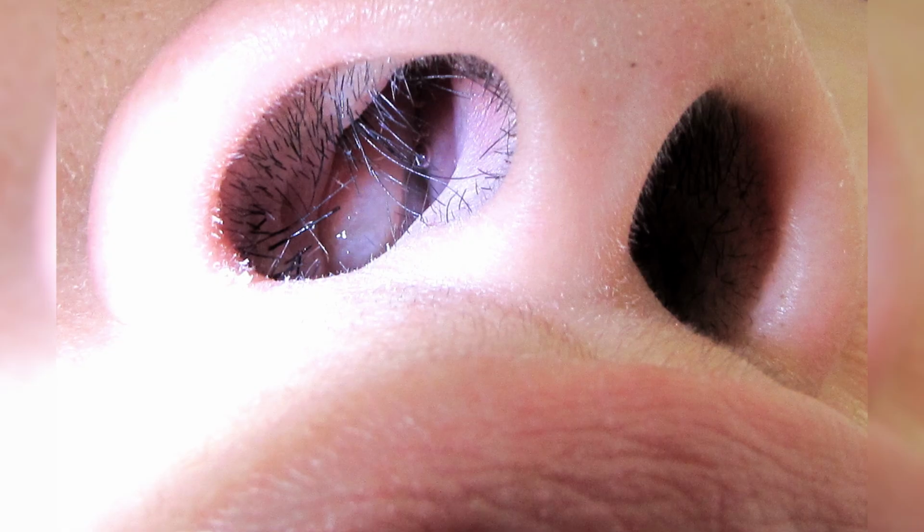Clinically, antrochoanal polyps are more common in adolescents and young adults, though they may occur in children, as illustrated in this case. The most frequent presenting symptom is unilateral nasal obstruction. Surgical removal is generally required, with endoscopic sinus surgery being the standard approach.